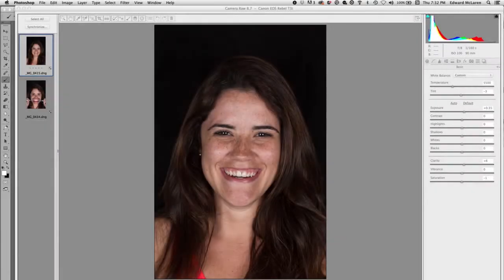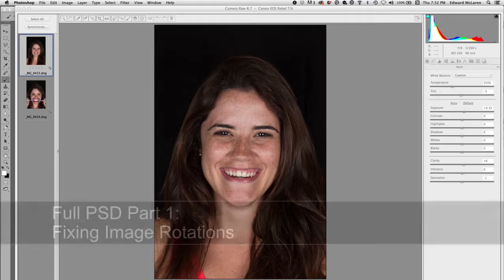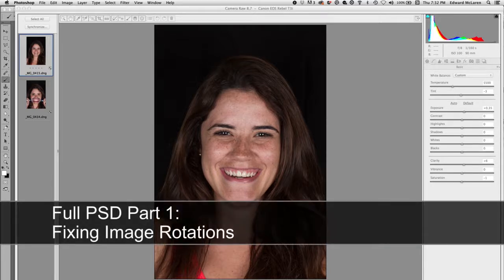Okay, I want to get into now what I'd like to call the full Photoshop technique, where we're going to do a full smile design, but with a little more advanced or intricate things we can do. We're going to actually measure in Photoshop, and we're going to use those measurements of the old teeth to translate to new lengths for our new teeth, which will allow us to be accurate in our design wax-up, ultimately our aesthetic prototypes, and design our new teeth fairly predictably.